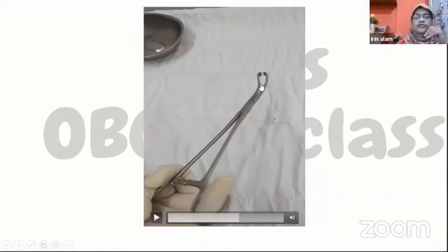And during vaginal hysterectomy and Fothergill's operation, we also hold the anterior lip of the cervix with this instrument. And we also hold the posterior lip of the cervix during colpotomy. These are the gynae uses. And what are the uses in obstetrics? In obstetrics, the use of this instrument is limited because it can cause injury to the cervix. We may hold the anterior lip of the cervix with this, and instead of this instrument, a sponge holding forceps is sometimes used in the pregnant uterus.